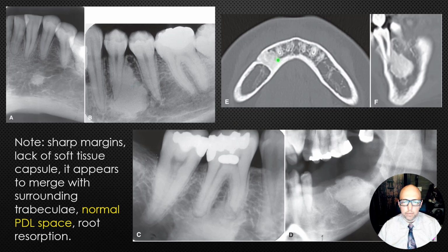Here we have some 3D images. Let's just jump down here. Here we have some idiopathic osteosclerosis. We also have some root resorption, which I haven't got to yet. But you can have some root resorption. I still don't see a lot of evidence of periapical inflammation here. Nice uniform PDL space. Pretty much uniform PDL space. Maybe you're losing that a little bit with the external resorption.